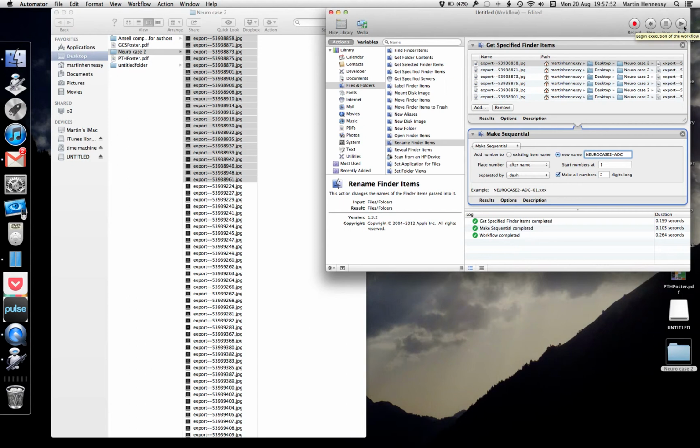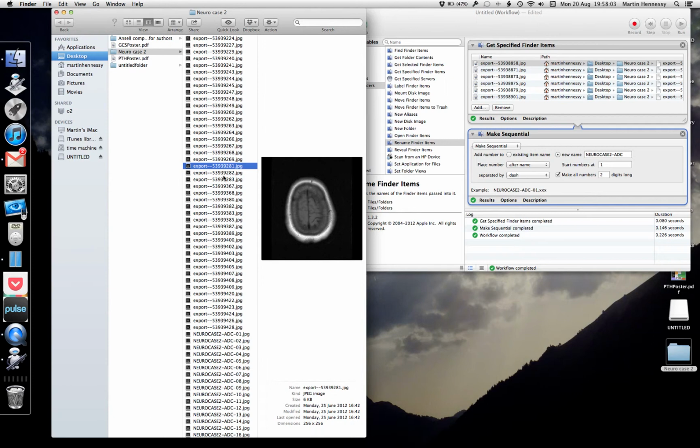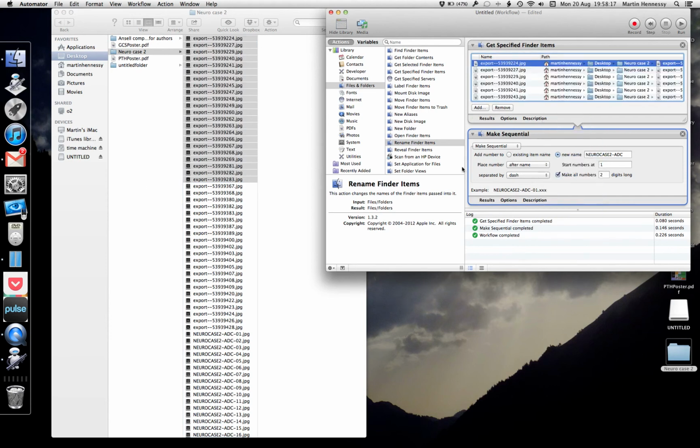Hopefully it won't make a difference. It's fine. And now in here we have got some T1 pre and T1 post contrast. So where do the pre-ends? Pre-ends there. Axial.